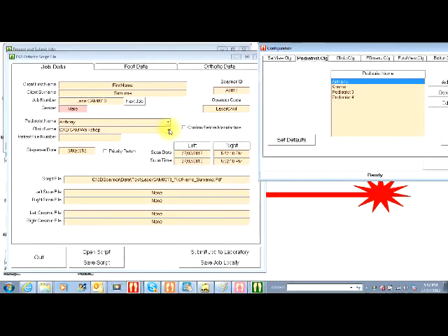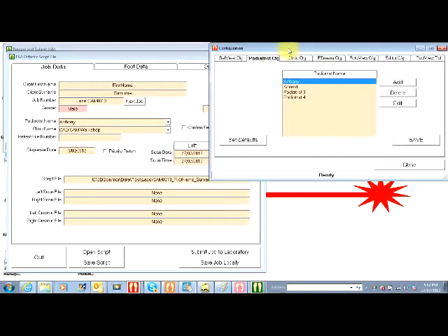The clinic name is called CAD/CAM Workshop, and you'll see that it's there. The reason is that these scanners can be portable, so you might have 4 or 5 clinics you're working from and you want to send them to all clinics.